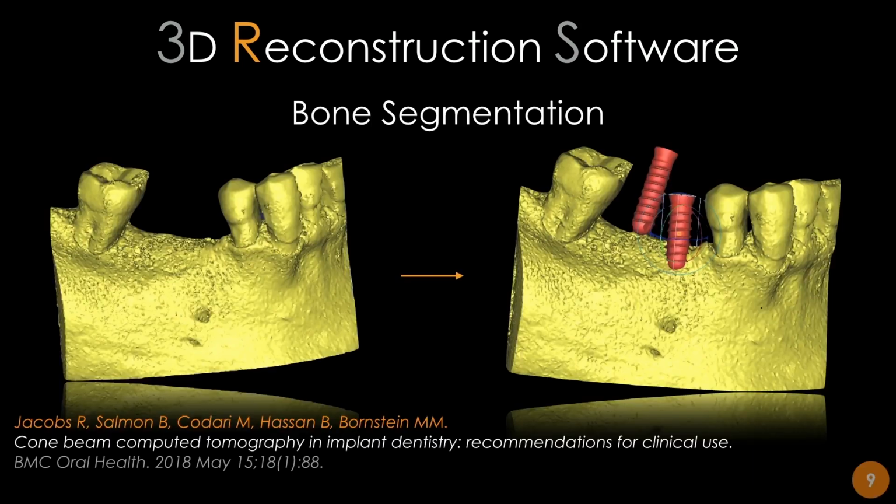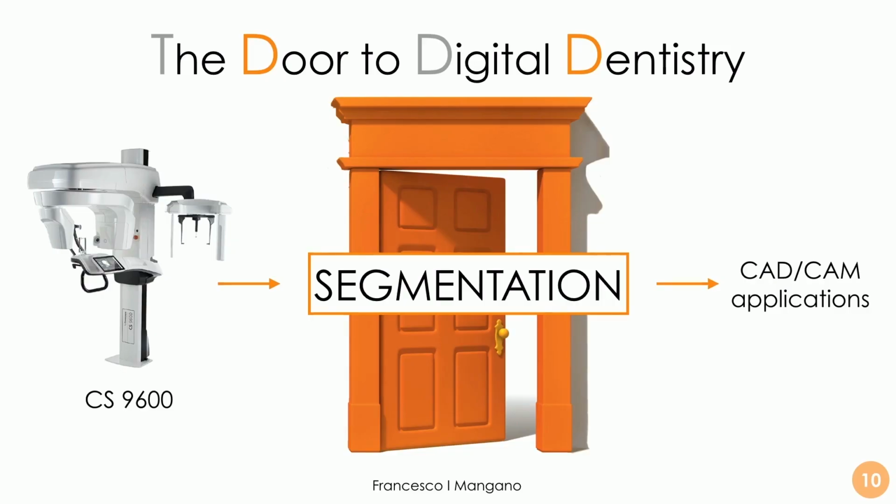But of course, the bone segmentation, which is a little bit more tricky and difficult than the simple visualization of the 3D structure, is not the only way to use the DICOM file properly, because the DICOM file can also be used by computer-assisted design software for guided surgery, and it is the most important application to date for surgery. Implant surgery and guided implantology is the most important application of the DICOM file, I think, in the field of dentistry and dental surgery.